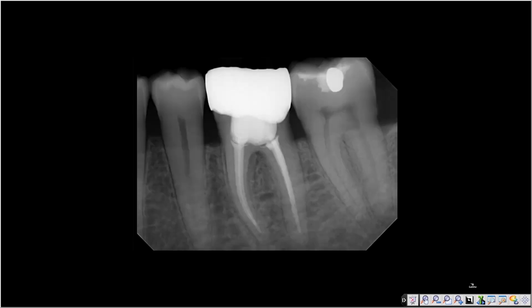So a more popular tool for brightness and contrast is going to be this gamma adjustment. The gamma adjustment allows us to make changes dynamically. What it gives us the ability to do is keep the high and low values of brightness and darkness stationary while moving everything in between.